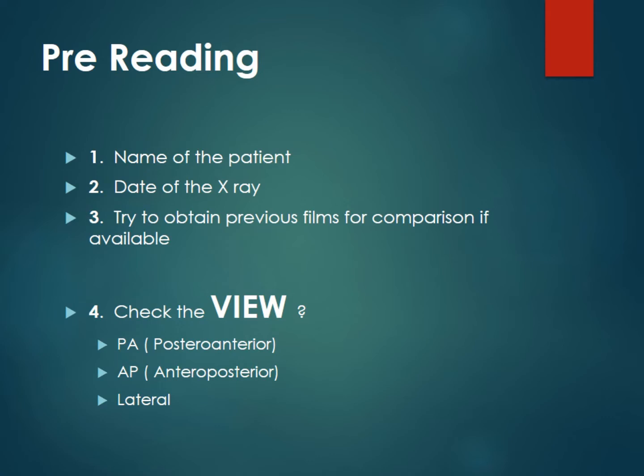And fourth important point is that always look for which view it is. Whether it is a posterior-anterior view of an X-ray, whether it is an anterior-posterior view of an X-ray or a lateral view, the view is always marked on the film.